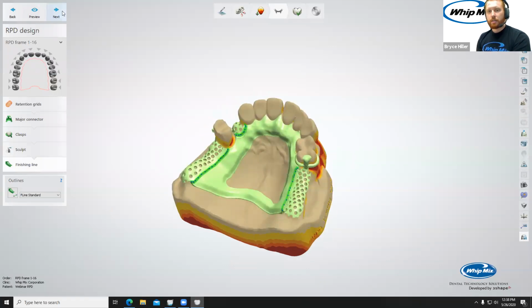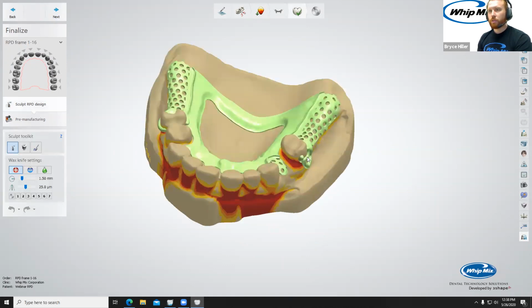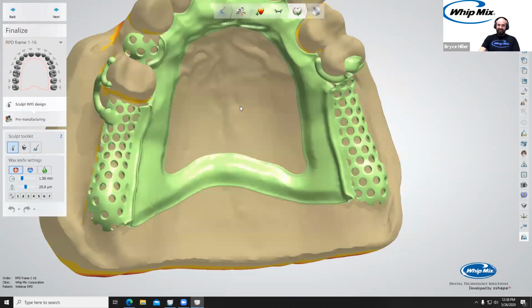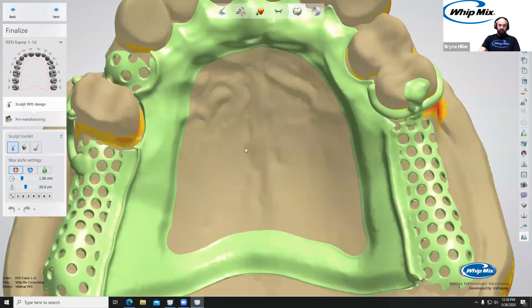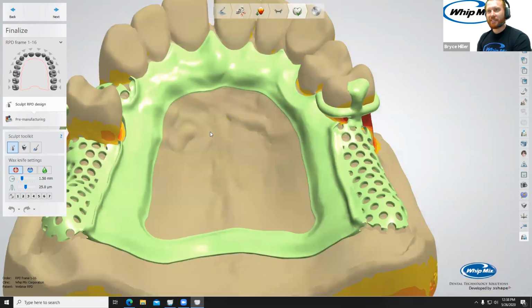I'm gonna click next. Look at that part. Look at that design. Look at that. It's flawless. Okay. I'm sure any of the RPD labs that are watching today are probably having a stroke. Oh, they're laughing at me right now. Yeah, laughing. Who is this clown?